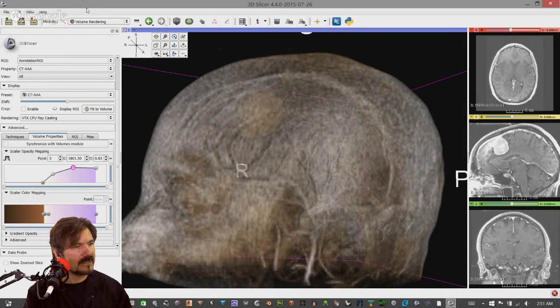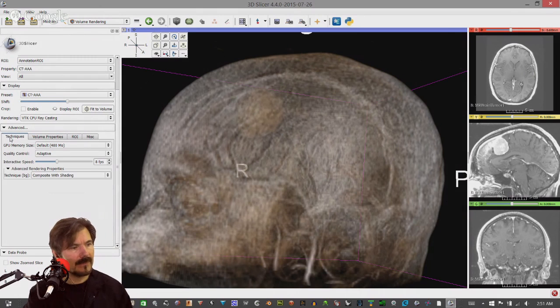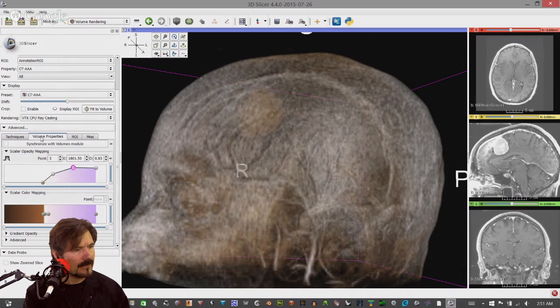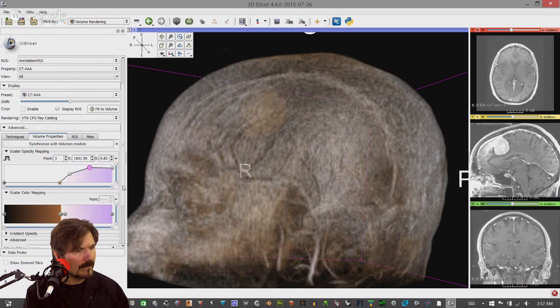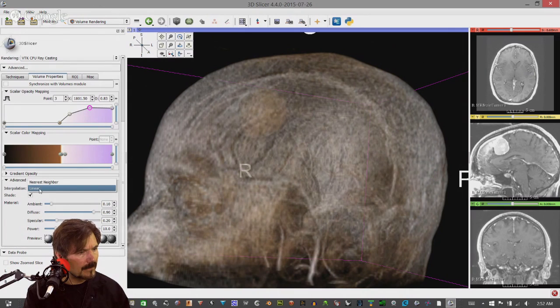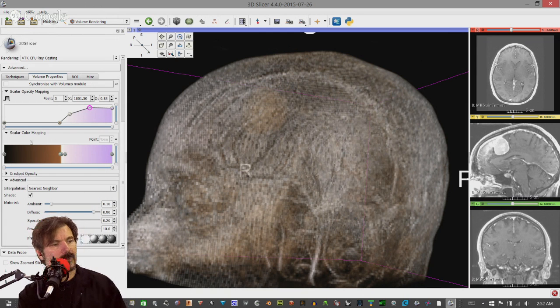But let me find, there is a setting that you can turn on. I thought it was here. Oh, actually, it's down here. You can identify the detail mode of it. So like here, well, we'll get to it. I don't want to take any more time.